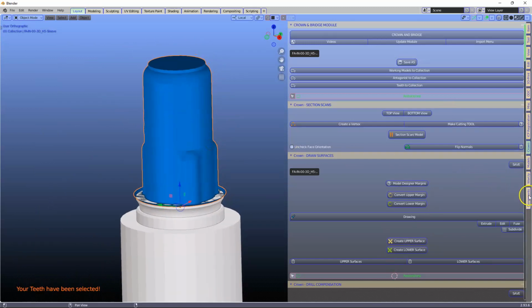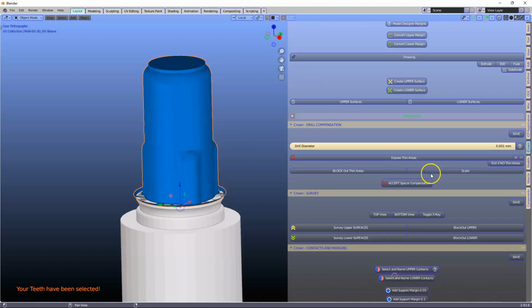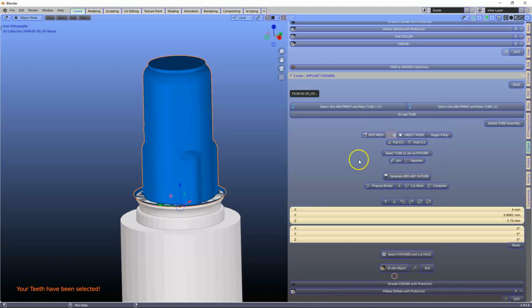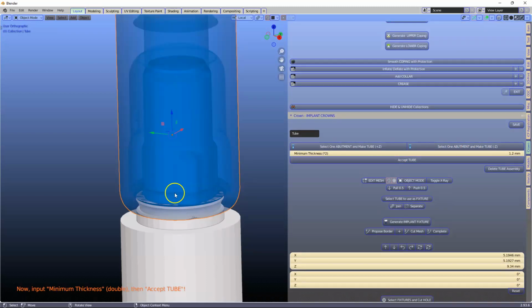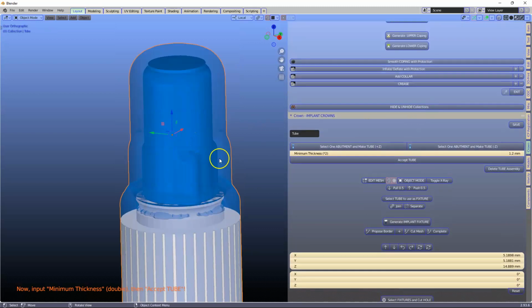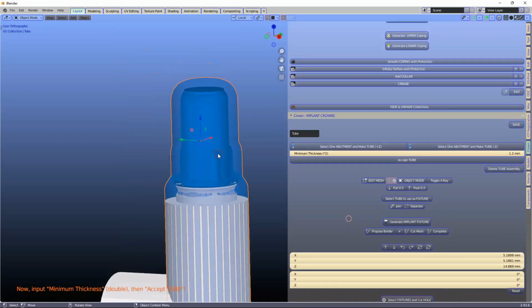We're going to go down to the crown module, and we're going to be making a little bit of a tube. Now, if you don't have this menu, this is an updated menu which allows you to extrude it either in the Z direction, up or Z down. Let's see how this goes. Now, this is the wrong direction, and we're going to extrude into the opposite direction.